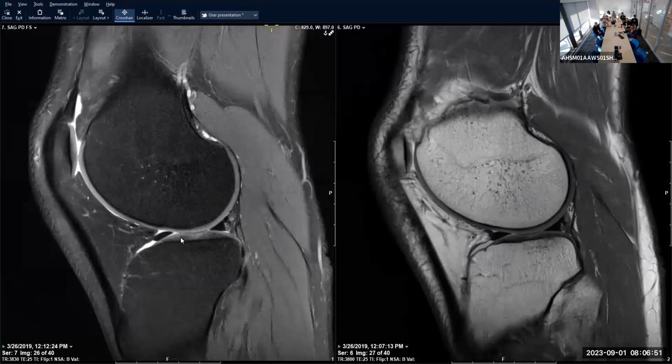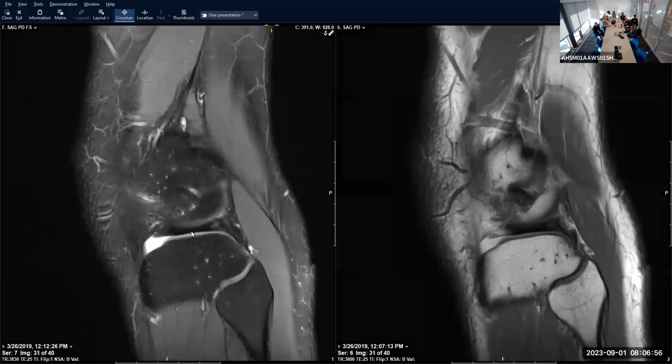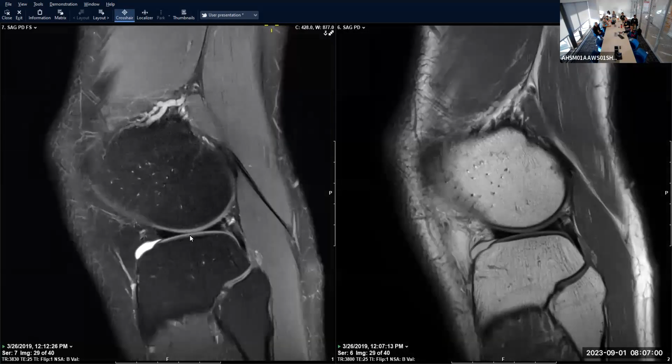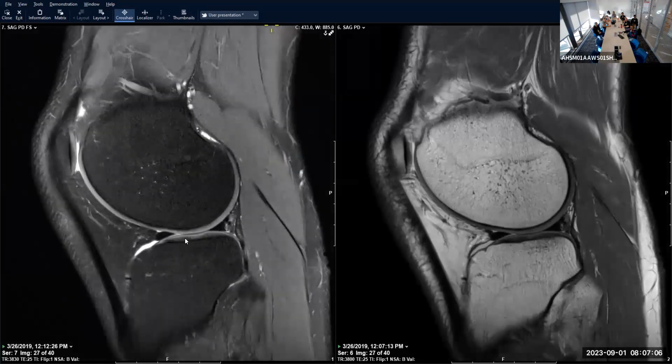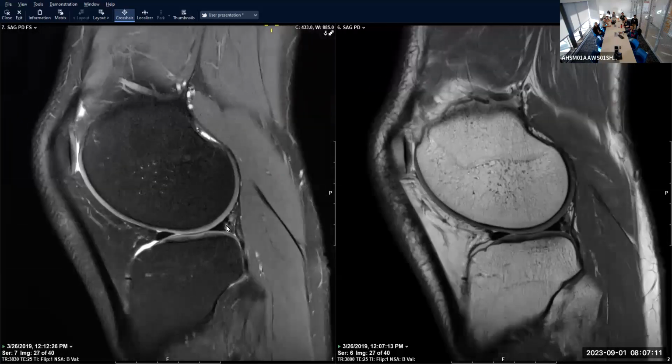So far, normal knee, right? We've got a normal looking lateral meniscus body segment, a nice block of body segment, and then we're getting into our bow ties. So I'm just going to give them a normal body, anterior horn, posterior horn, articular cartilage with nice intermediate signal intensity overlying the nice thin subchondral bone plate. And we're getting into the intercondylar region.